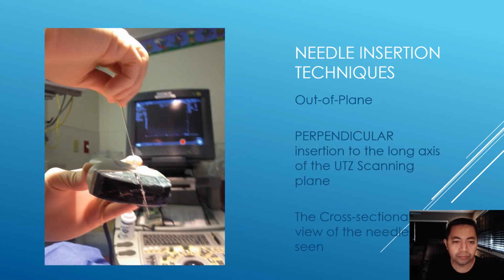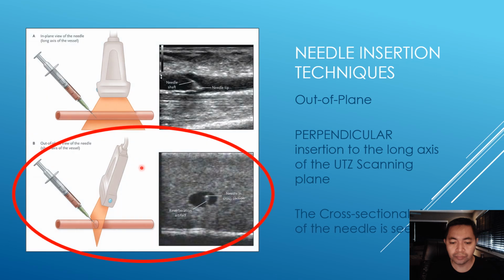In contrast, this is the out-of-plane technique, wherein the needle is inserted perpendicular to the ultrasound scanning plane. This is seen in the diagram at the bottom.